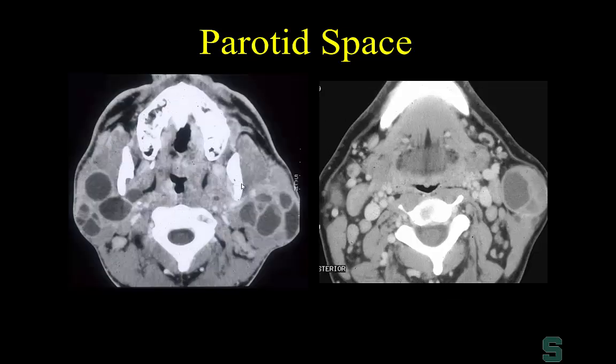Now, this was a diagnosis that we used to make 20 years ago when I was a fellow. If I told you that this patient was HIV positive, then what's the diagnosis that we see here? Anybody? I remember 20 years ago, everybody would get this diagnosis. Yeah, lymphoepithelial cysts, exactly right.